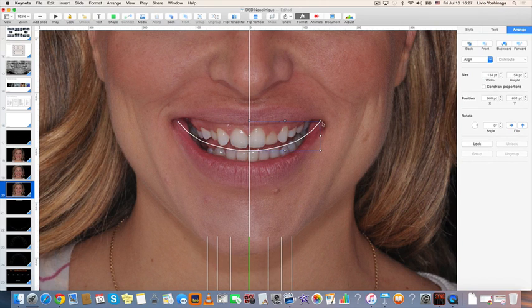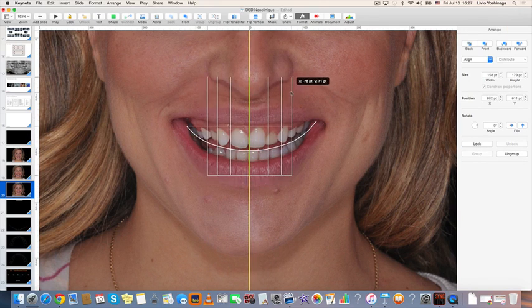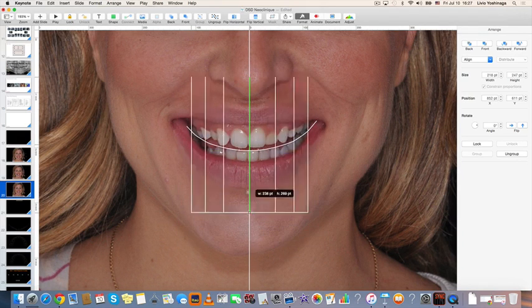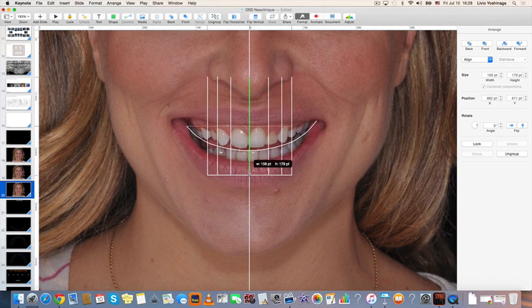And now the curve, I can adapt the curve, look into her teeth, trying to make this curve as natural, as harmonic as possible, respecting her teeth position. Now we have done the smile curve. This can change later, but right now it's enough. So here now it comes to the interdental ruler. We're going to change until we find, in her case, if I go straight on the central here, using this as a reference, I can complicate a little bit my life here. So, like we said on the exercise, we're going to make my life a little bit easier.